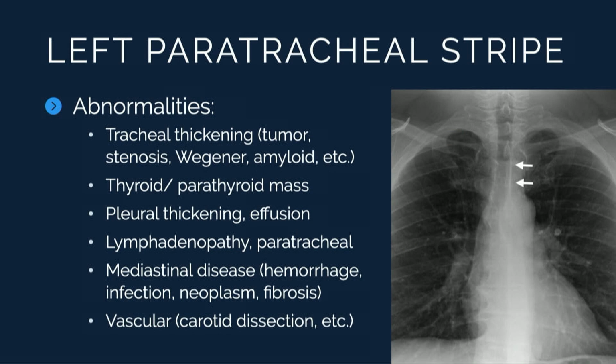So what about pathology of the left paratracheal stripe? Very similar to the differential considerations as we saw on the right, but in this particular case, we're going to include more vascular considerations, particularly of the arch vessels tracking along the left paratracheal region.